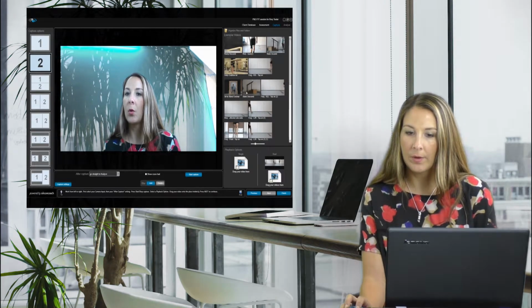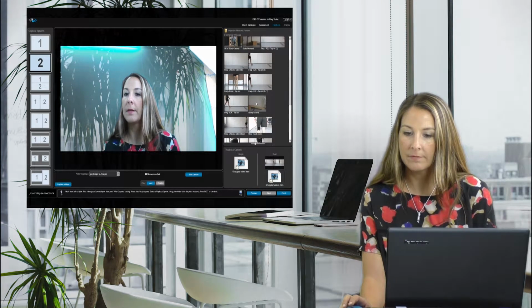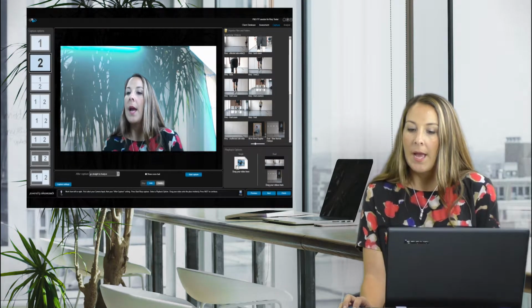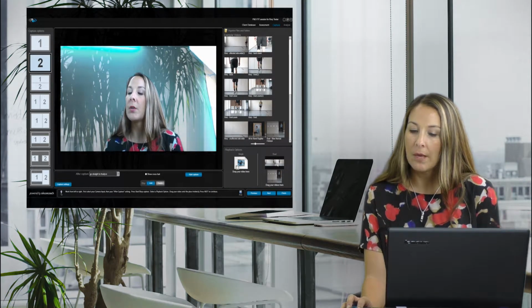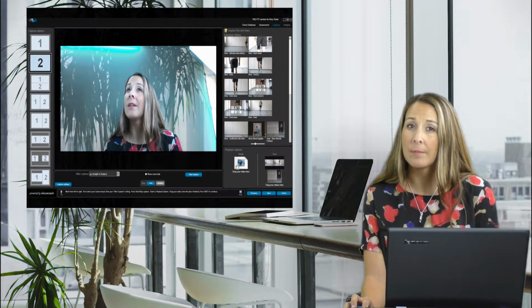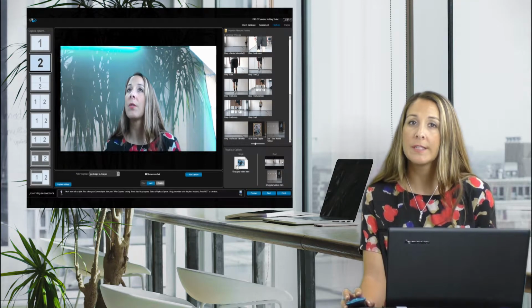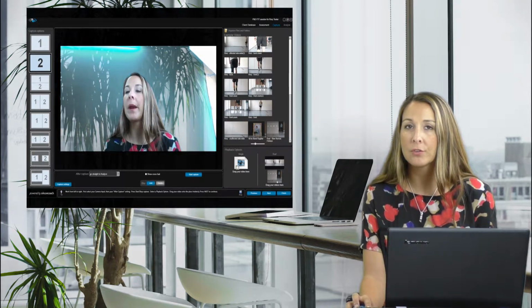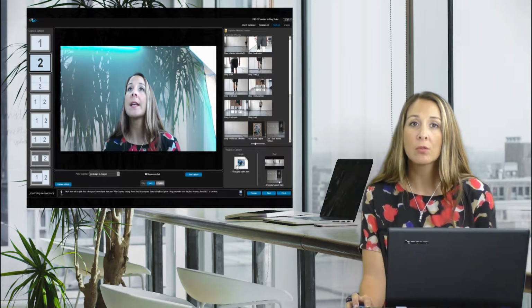And then I'm going to pull my video of him in a different, there we go. So I had taken 2 different videos at one point in time, and I had compiled them to create one video. So it took the sagittal and the coronal and it compiled them. And now I want to compare it to a different instance, which again has a coronal and sagittal.